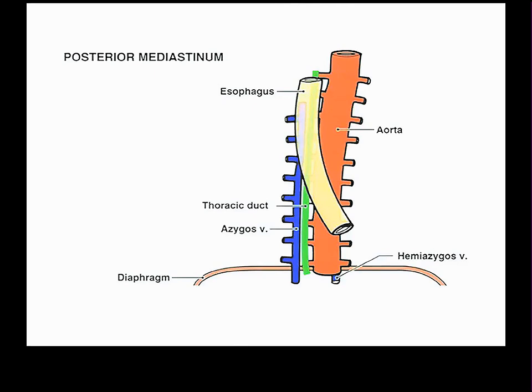You don't even know what the azygous vein is, do you? Right? If you read ahead, you. Azygous vein is a big vein that drains the intercostal spaces. And I actually showed it on a CT previously as joining the superior vena cava, but not important now. It is a major body wall vein draining the intercostal spaces, and it's always to the right of the descending aorta, and always to the right of the thoracic duct, which lies in between them. And the esophagus comes back and starts out sitting anterior to the thoracic duct, and then as it descends, moves on to anterior to the aorta.